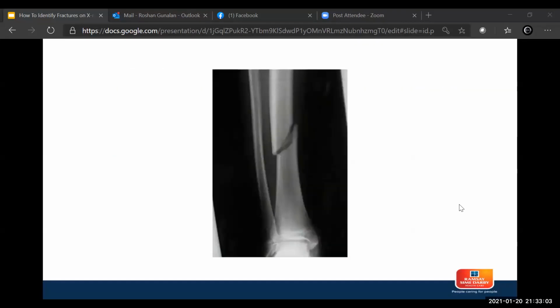Oh, there's another one. I don't know why I put this. Oh, yeah, I know why I put this. Okay, let's see who can get this. This one only a star student will get. Okay, come on, star student, we have a lot of star students, without the typos. Come on, it's always the same people. We have 100 people. Okay, the rest put the Zoom on and went off somewhere.